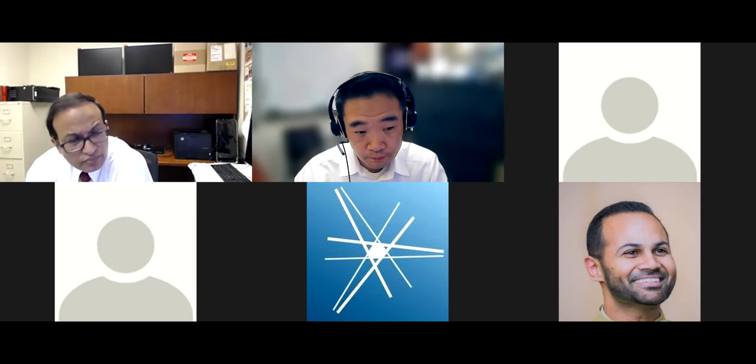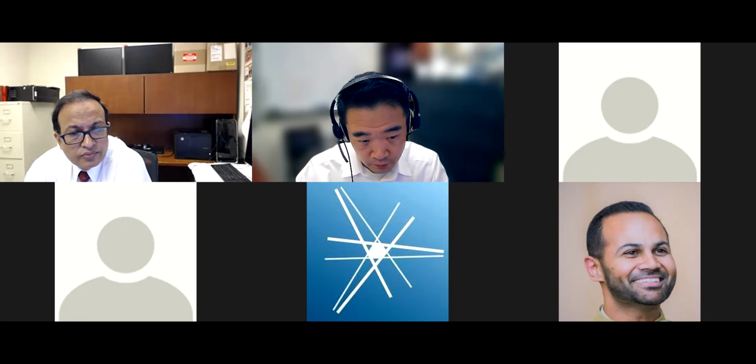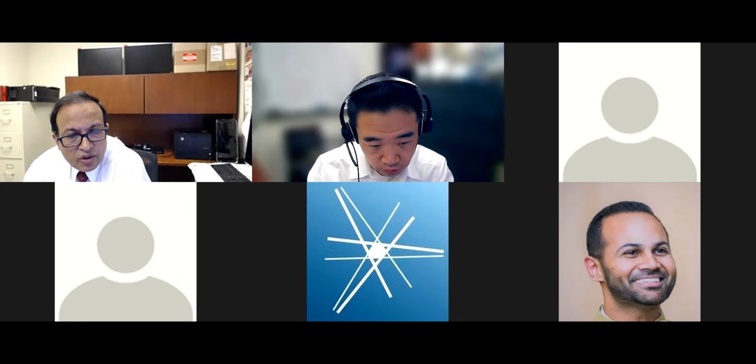Some of our deep learning auto segmentation was approved a couple of years back, so it's on the 4th iteration. We released it in version 8B, and others on the call mentioned that we're currently on 10A, and 10B is the release. So we've been improving that AI algorithm for 4 iterations now. So it's very robust.